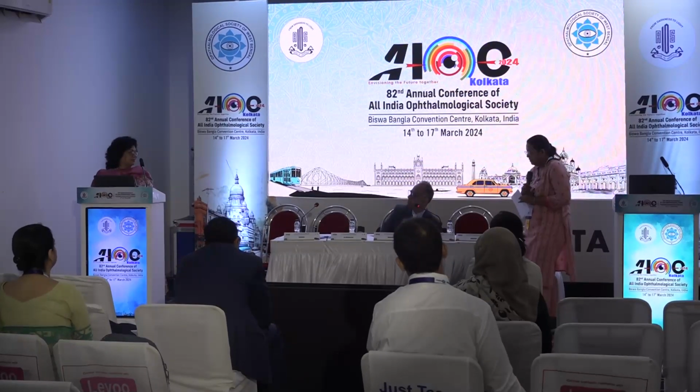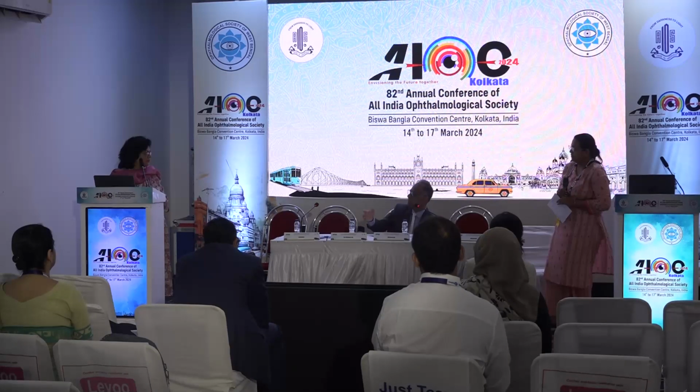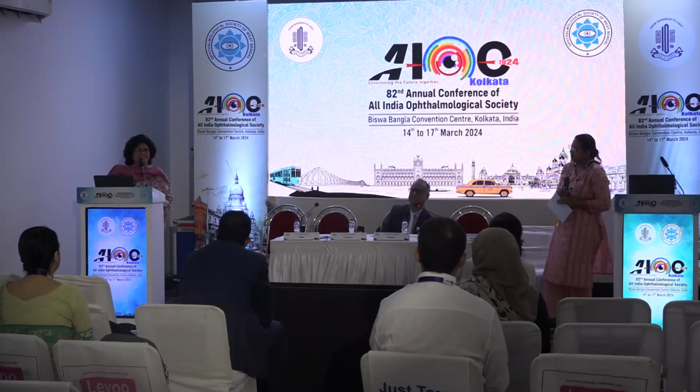Which machine are you using? That is RetCam. RetCam only? RetCam. It is not available with the Indian-made 3nethra? No, it's available now, sir. They have come up, and we've done trial cases on that also. It works equally well. Okay, but all these images were RetCam images.